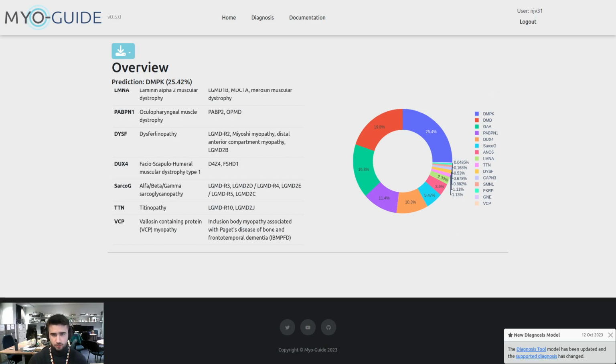It's very important to note that the results you are seeing right now correspond to a healthy patient with all scores set to 0, and that consistent and correct scores are required to obtain reliable results. While the model supports missing scores, the reliability of the model will drop down if there are a lot of scores missing.